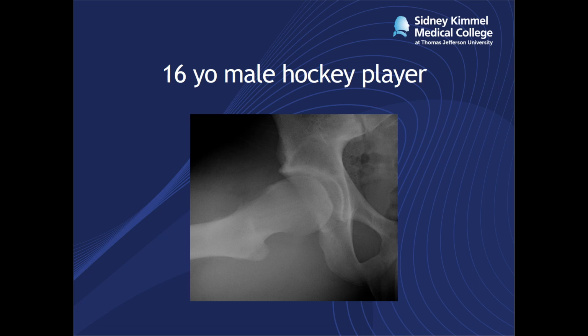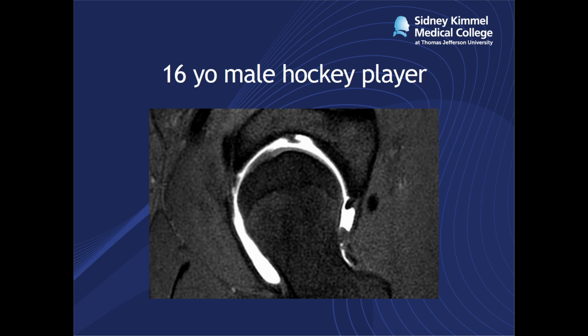And then when the patient goes on to MR, we can actually see that the anterior superior labrum is not looking very good. Here, if you just compare the posterior labrum, kind of uniform low signal, a nice morphology there. Here it's very irregular, has probably some contrast within the substance of it, and it's partially detached at the base here. So this is an anterior labral tear, and again, you can see that little bony prominence here.